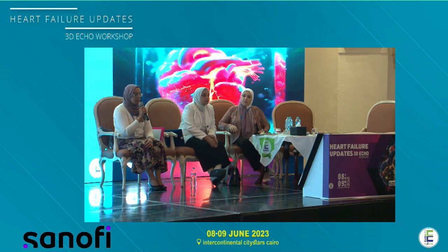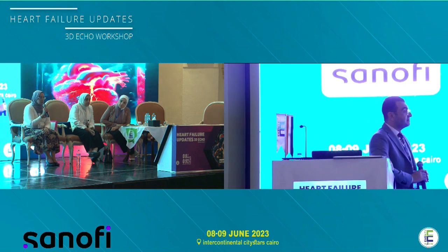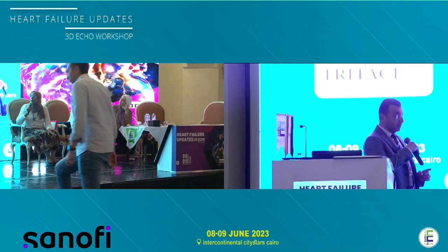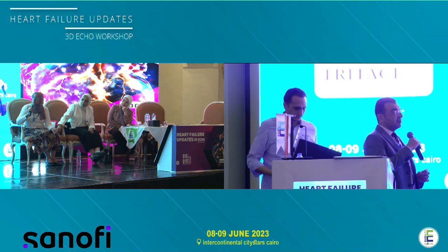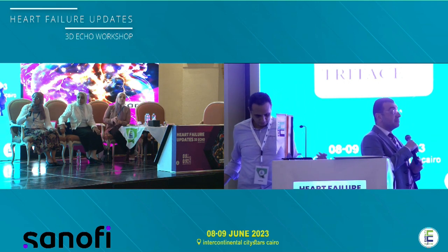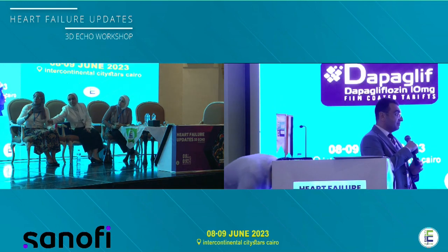Thank you, Ahmed. This is very interesting, and you completed the images for how to assess the defect for closure. But what about PFO? Does the same technique apply for choosing the optimal case? Yes. The rims, the adequate rims? Actually, the rims are not a problem with the PFO, except if you have an interatrial septal aneurysm reaching the roof of the atria. That makes the device unstable later on and has a tendency to embolize. It is a contraindication.